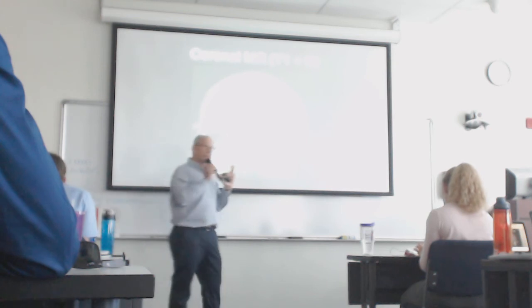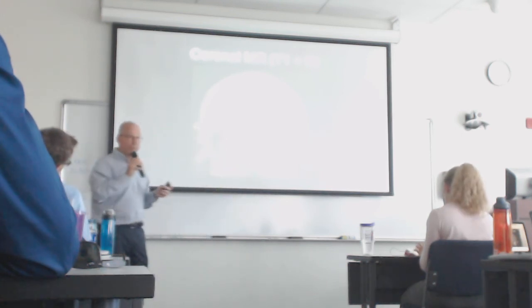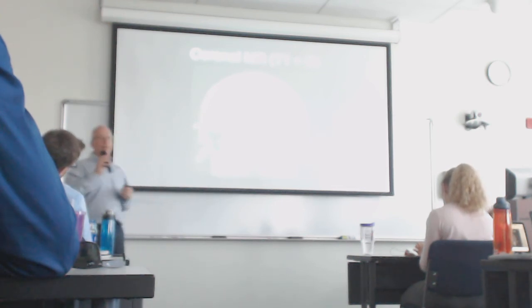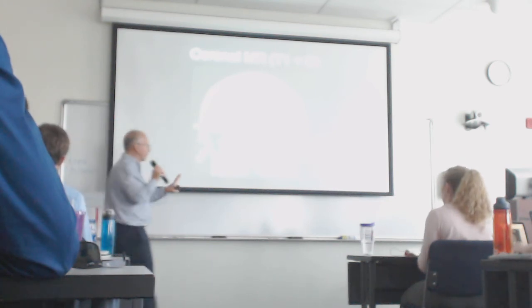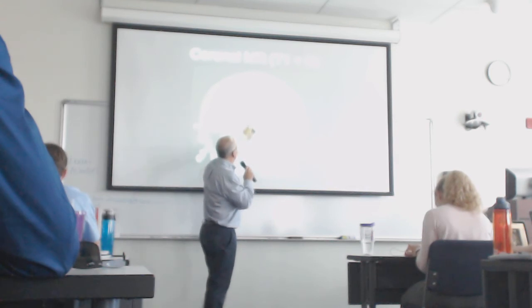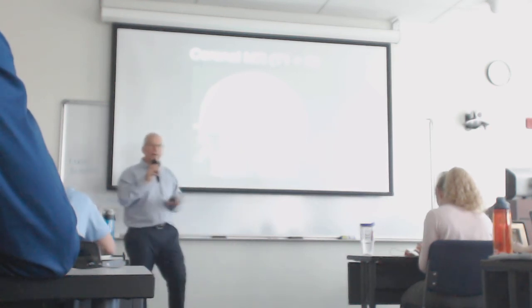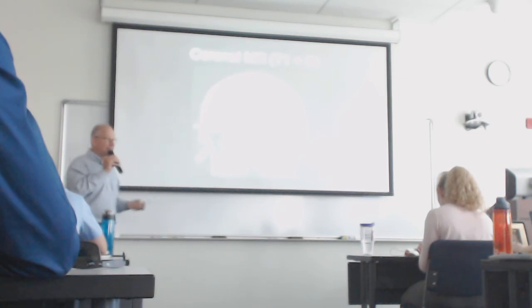Now this one, just to confuse you, which I'm not going to do on an exam, is a T1 weighted image with contrast with the gadolinium. And when we use gadolinium, we want to use T1 weighted imaging. It's not important why. But all these meninges now are lighting up. The lining of the brain lights up nicely, all the blood vessels. The internal cerebral veins light up. Here's part of the middle cerebral artery. So the contrast material, the gadolinium, lights up the blood vessels, lights up the very vascular tissues.